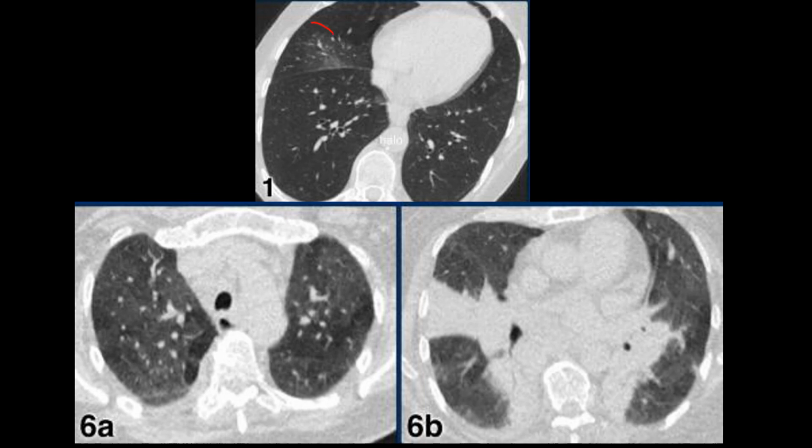So this is a case where there is unifocal ground glass opacity. What COVID-RADS says is multifocal, present in the periphery, along the visceral pleura, and bilaterally involved. So it is only unifocal, one patch of ground glass. You cannot call it COVID. It can be some other disease as well, but can it be COVID? Yes, it can be the earliest manifestation, or only part involved. Rarely it might happen as well. So that's why we cannot exactly tell whether it is COVID or whether a non-COVID disease is causing this kind of ground glass opacity.